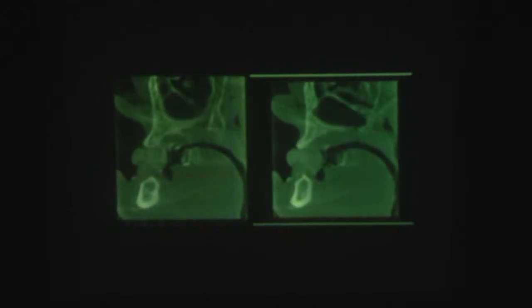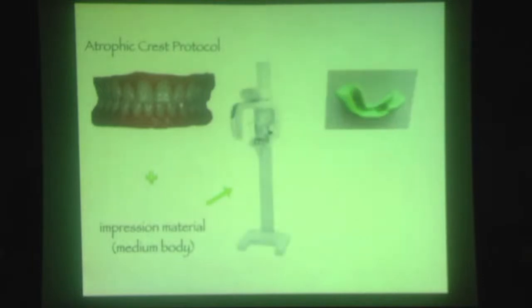And the other thing, in the cross-sectional views, you can easily see that it's almost impossible to place implants in the lower jaw. Why? Because it's worse than a triangular shape. You see how we can do. At this point, we have to choose the right points, the right angulation and the correct width of the implant.